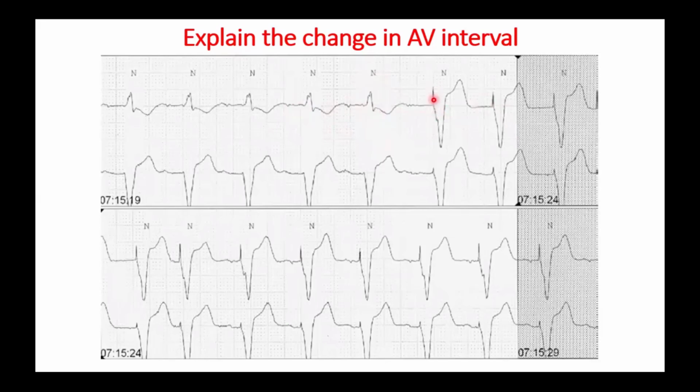Once there is no conduction, V pacing occurs for some beats, then it shortens and returns to the sensed AV interval. And once spontaneous ventricular activity is sensed again, the AV interval is prolonged to the new value. Is it clear? Is this search AV hysteresis?